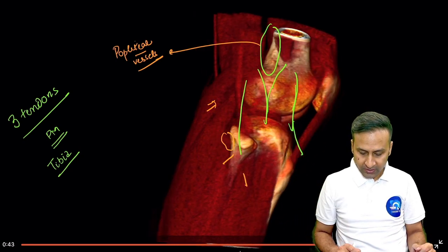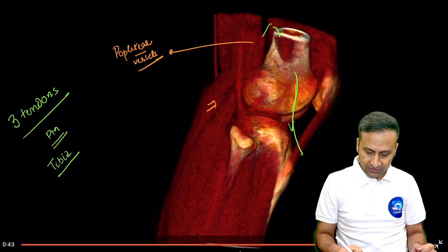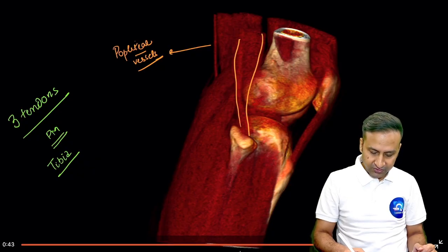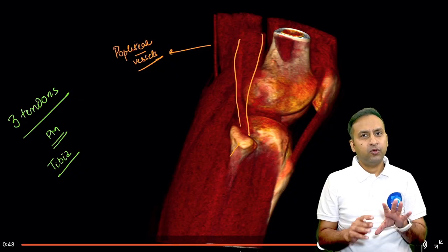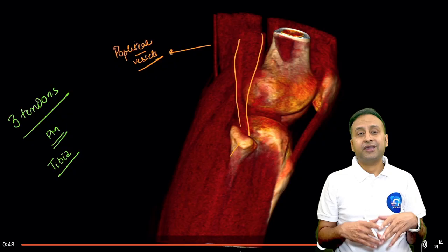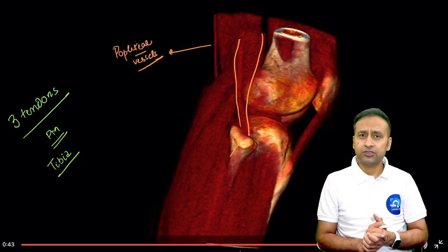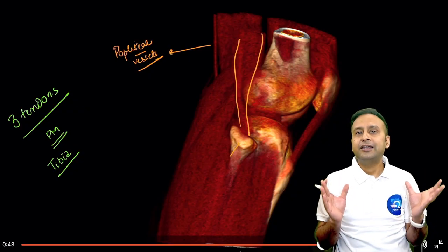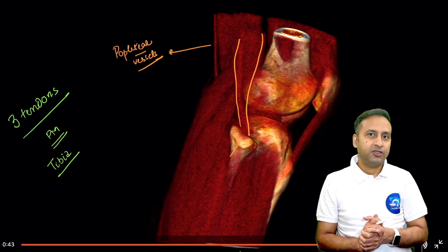And when I'm moving it further along the lateral aspect, along the lateral compartment, I hope now everyone would be able to see this particular tendon quite clearly, which was inserting over the head of the fibula. So in this particular session, we'll be looking at all these muscles, all these tendons and their relationships with each other as well as with the knee joint. But to begin with, I hope everybody of you would now at least have a basic framework of the different muscular groups that we can expect when we're going to discuss the MRI of the knee joint in cross section.